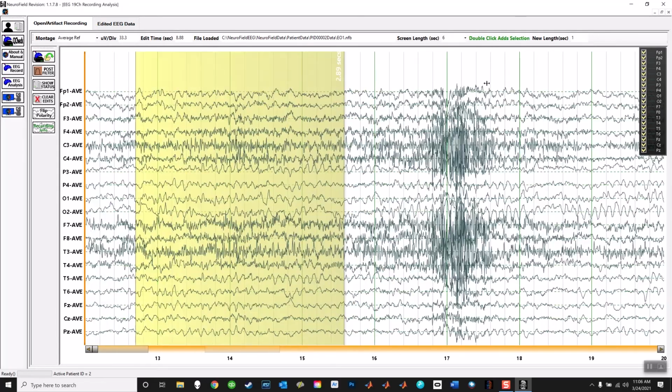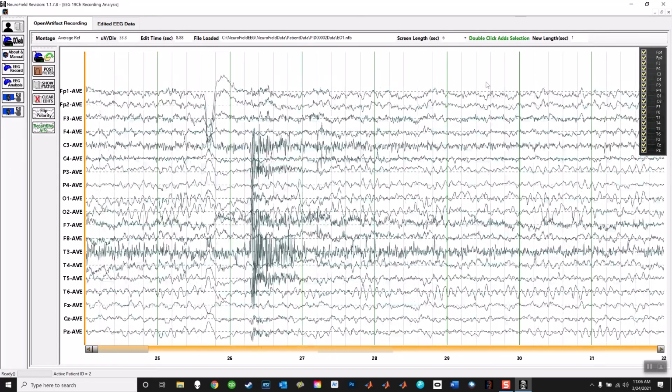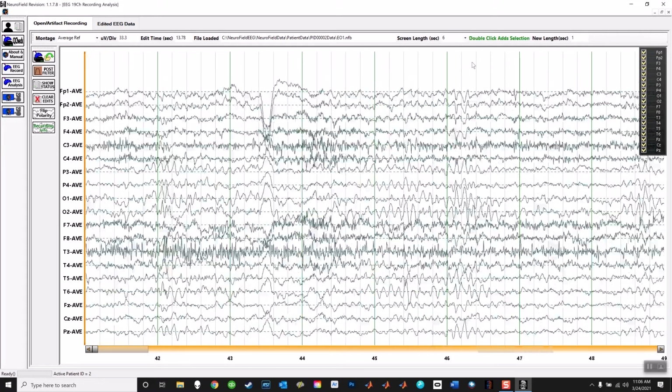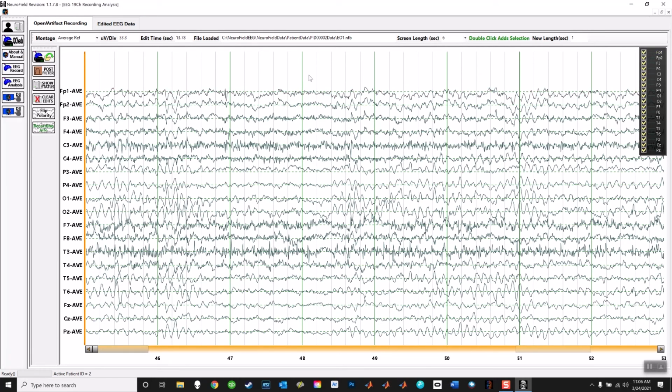Now in the EEG world, you want to grab a good 60 seconds of artifact-free data. I have a couple rules for doing that. Whenever you're examining data, you start from the top and you look at FP1 and FP2. The first question you ask, is there an eye blink, yes or no? Then you look at F7 and F8 and you look for lateral eye movement. And you say, is there lateral eye movement, yes or no?